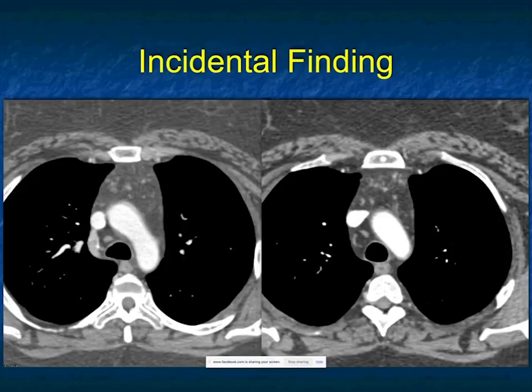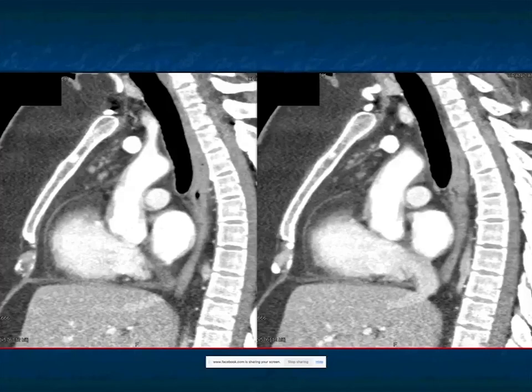A really nice case. Incidental finding, anterior mediastinum, lots of tissue. Thymoma, more solid. Thymocarcinoma, really solid. It looks like fatty infiltration. You can just say fatty infiltration of the thymus. That's a possibility. This was a bit older patient. It has some mass effect.